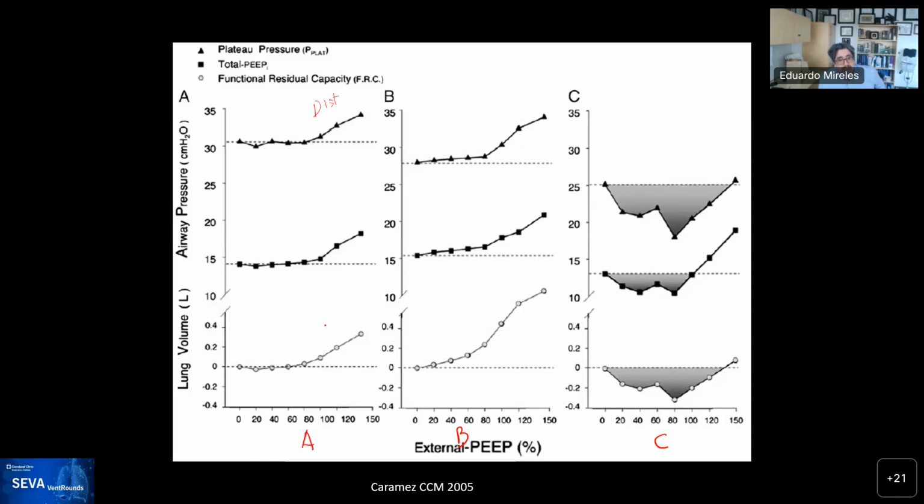That would be like yay, everybody happy and super smiley. What we saw is this one, and so we ended up setting the PEEP around this number. It was around 8 for this patient, at which the patient would obtain the maximum CO2 elimination efficiency, and the plateau remained the same for her. So that's all I have for you folks today.